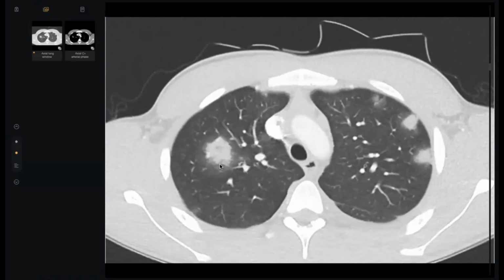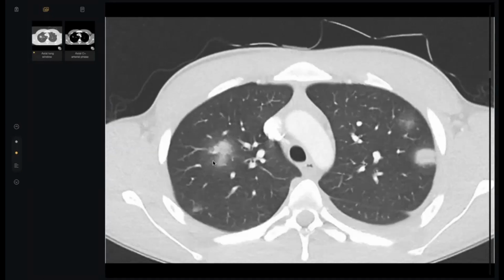What is the pathology under this ground glass? What do you think? It is infiltrative, which means it goes within the interstitium of the lung. When something infiltrates, you are talking about the mechanism of ground glass in metastasis. But ground glass could also be due to bleeding or hemorrhage. Ground glass is common in infection and metastasis.